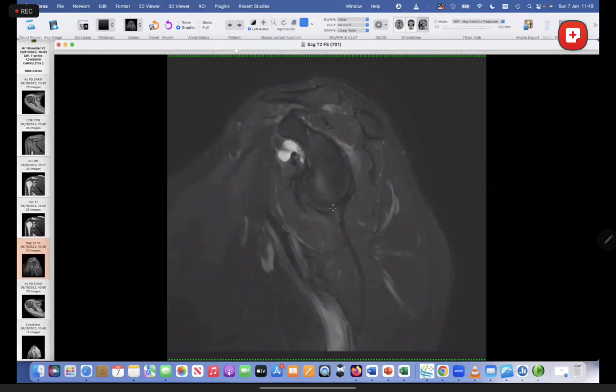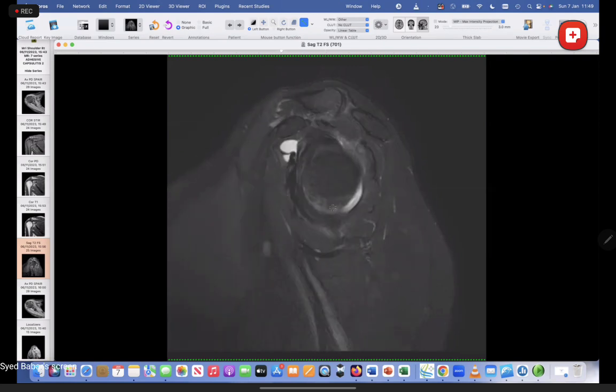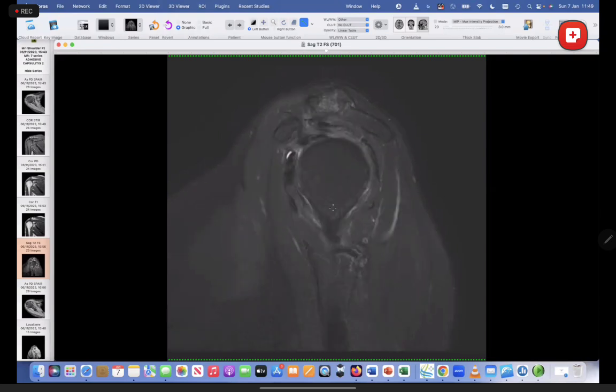This was just, by the way, a tease question because it was there. And I just wanted to see if you knew your anatomy, which clearly you girls don't know and boys don't know your anatomy, because teres major is way on the other side, somewhere here. This, by the way, is the circumflex humeral vessels circumnavigating the humerus.